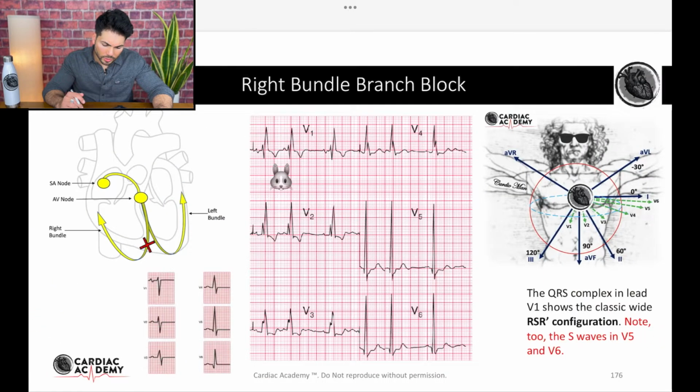All right, so we can see here in this example, the first step is to look at the QRS complex to see whether it's widened or not. And we can see here that, in fact, yes, it is widened. You can see how it starts here all the way to here. That's more than 120 milliseconds. So yes, the QRS complex is prolonged.